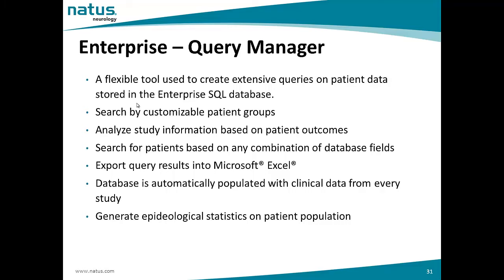So why is this important? Because when doctors or physicians are doing research, they want to create bar charts or pie charts for their presentations or their lectures. This will be a very, very helpful tool. This database is automatically populated with clinical data from every study. So with the query manager, you can generate the epidemiological statistics on your patient population.